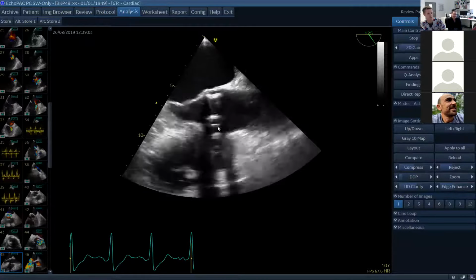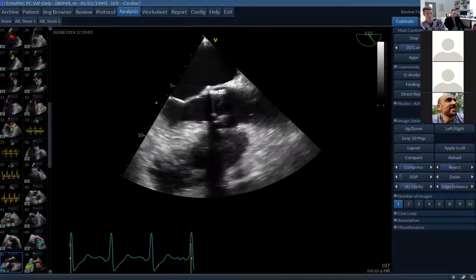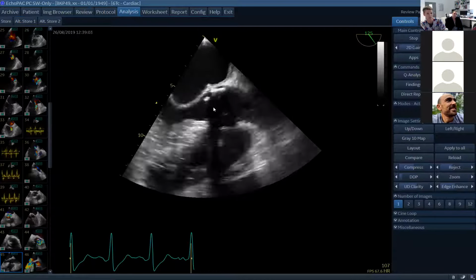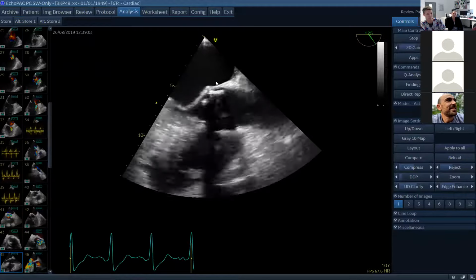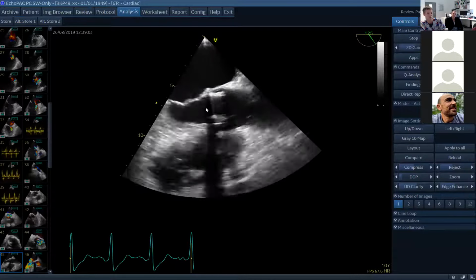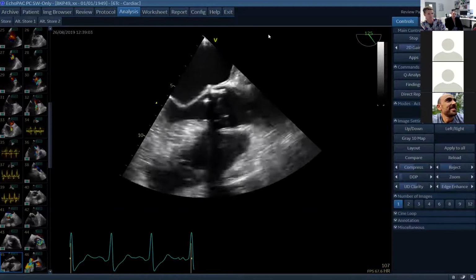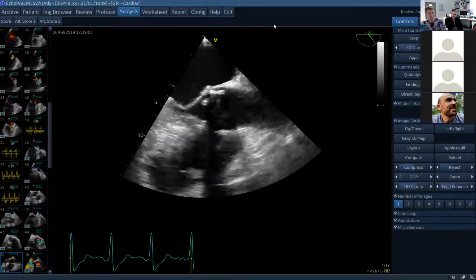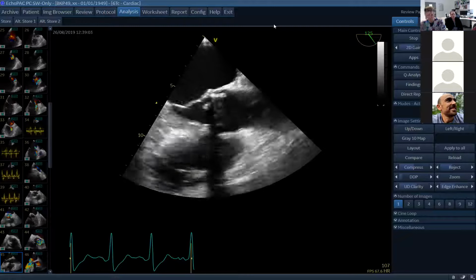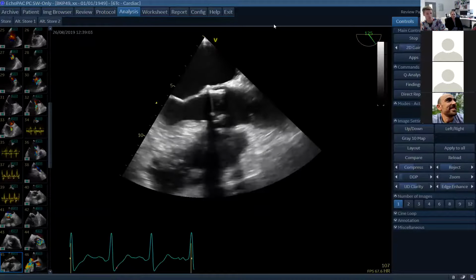First of all, you would be expected to recognize that you've got a bioprosthetic aortic valve replacement, because you can see things flapping about, but there's also this shadow artifact in the background. What are we seeing in here? What's in the LVOT? Anyone can tell me? Is it normal? No, it is not normal.